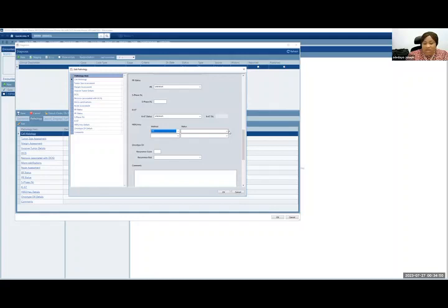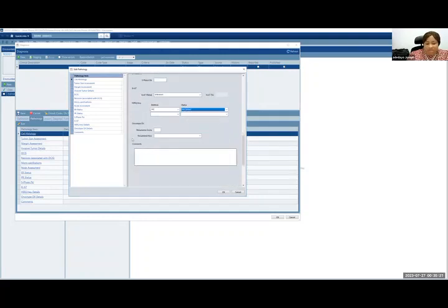Just to go over that again, for HER2 status, immunohistochemistry has been done for these patients, and they said she's positive. If they say she's HER2 positive, then we know that it is 3 pluses. If we have more information to say it is equivocal or negative, negative means that it is 0, not amplified. If it is equivocal, then it is 2 pluses. So that answers all those questions. If we don't know and it was not tested, then we say it was not tested. So you specify all of that.